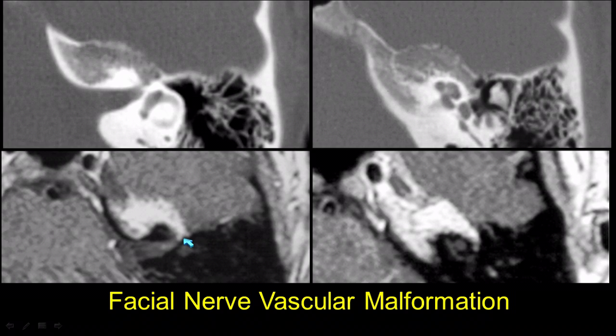So we think about these lesions sometimes showing up where vascular loops and segments come together. So we might see this lesion at the geniculate ganglion, or we might see it at the porus acusticus, the opening of the IAC.